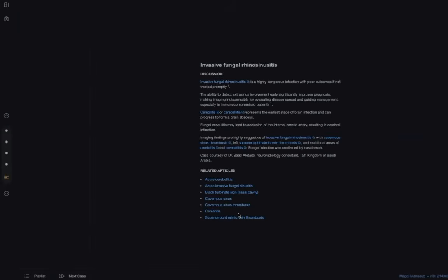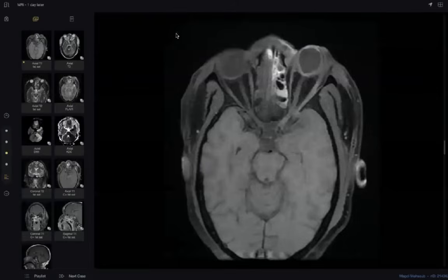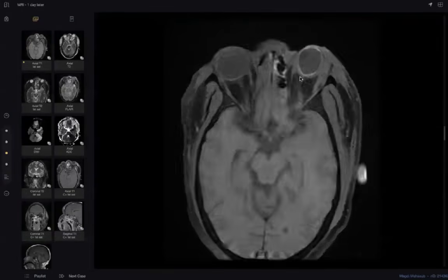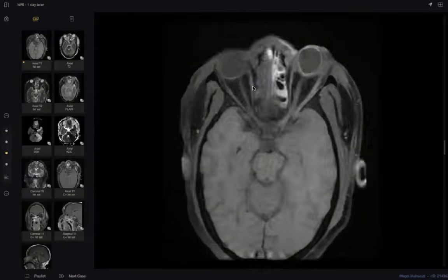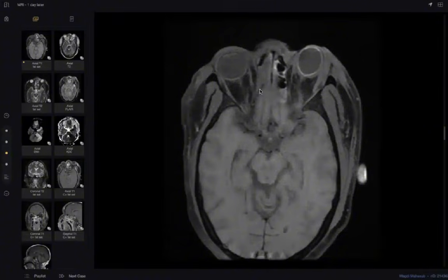For the globe, I think in one of the MRI images it appears irregular. Looks like a coloboma, some collection outside. Looks like rupture or something. In the MRI, the globe is distorted; the AP diameter is elongated. I don't know, but at least the AP diameter is increased. Looks like coloboma. However, in the CT it is not obvious. Maybe after fungal sinusitis, some changes occurred.